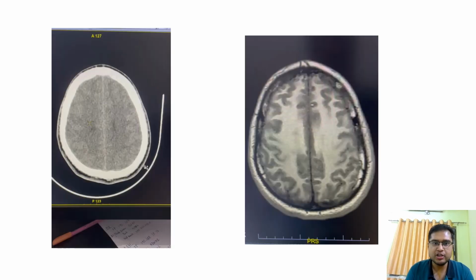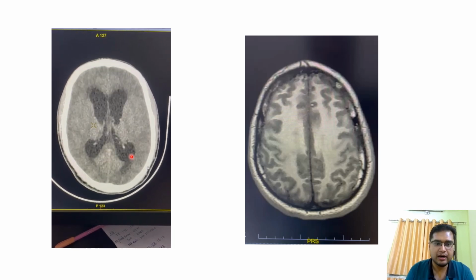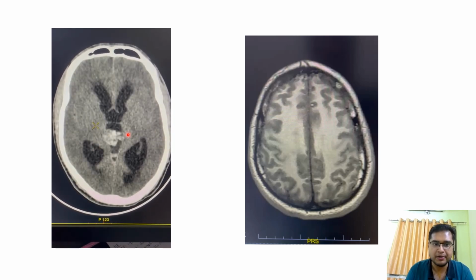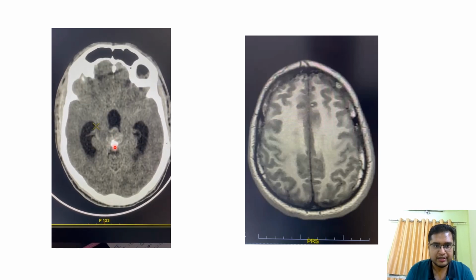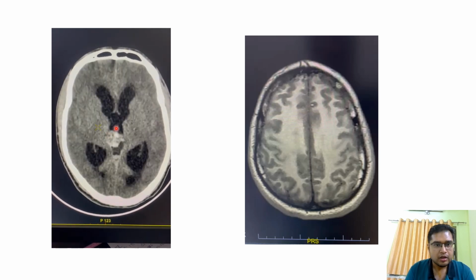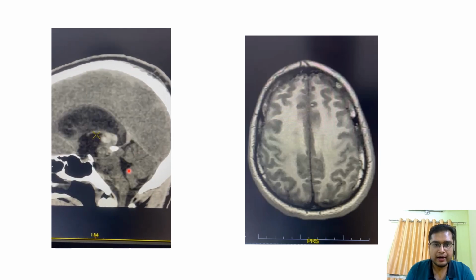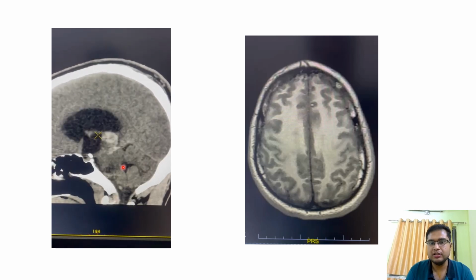So now coming to my next case, she's a 22-year-old female who presented with severe headache and convulsions, and this is the NCCT of this particular patient, where we can see gross dilatation of bilateral lateral ventricles with transependymal periventricular edema, and then there is a soft tissue density mass with multiple calcifications and a large dense central calcification that is seen in the pineal region.